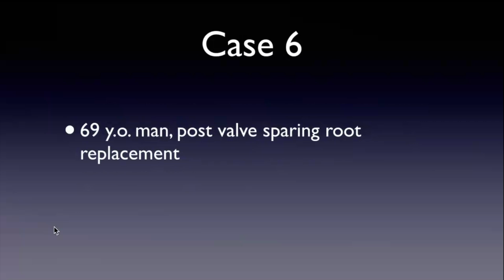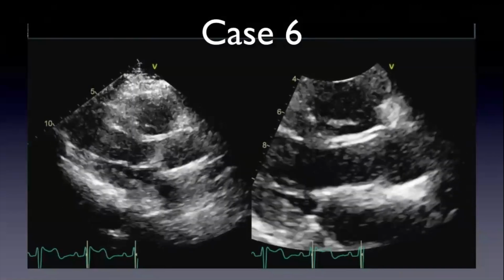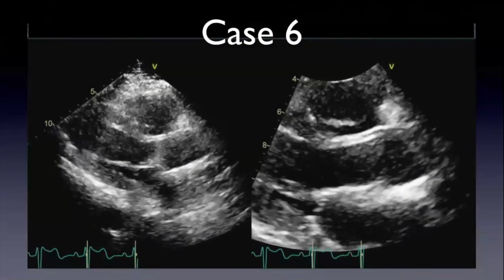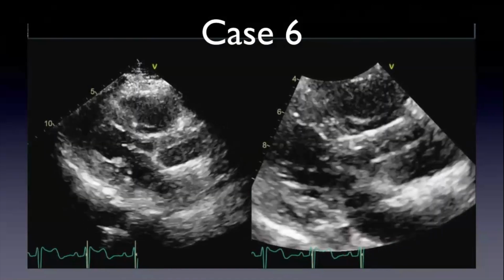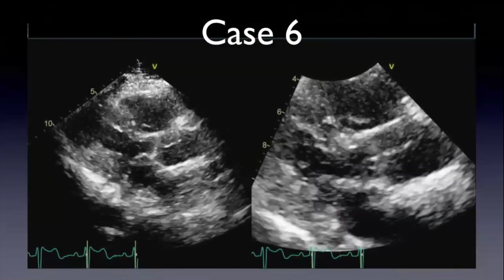I'm not sure if I showed the fellows this case before. Maybe not. Did I ever show the fellows this case? No. Okay. Well, I'll ask the fellows to tackle this one. This is a bit of an unusual case, but it's not impossible. Okay, Rudy, you can do it. And you could have your friends chip in. That's okay. She'll help you out. I know they support you.